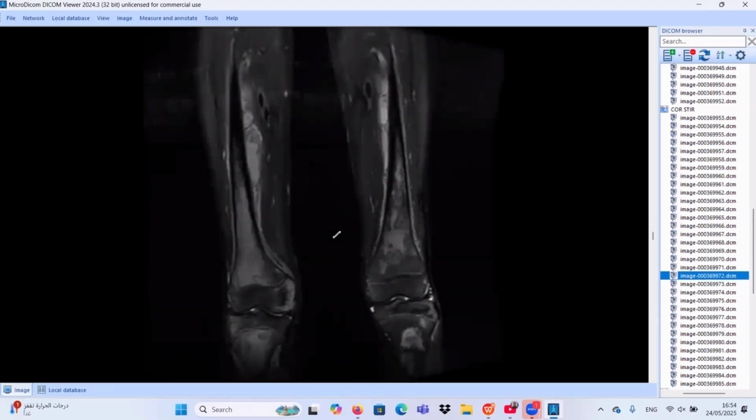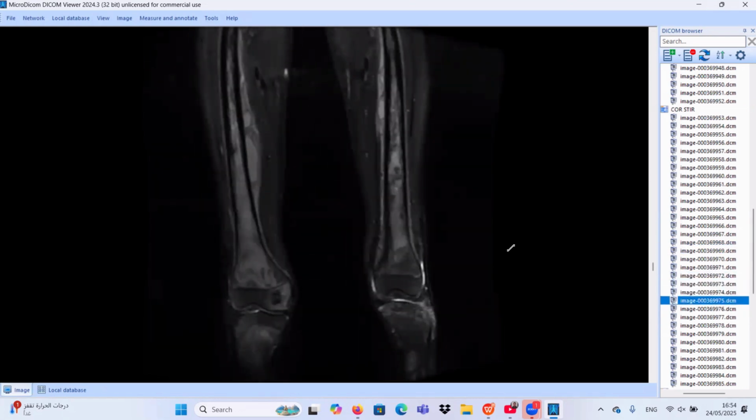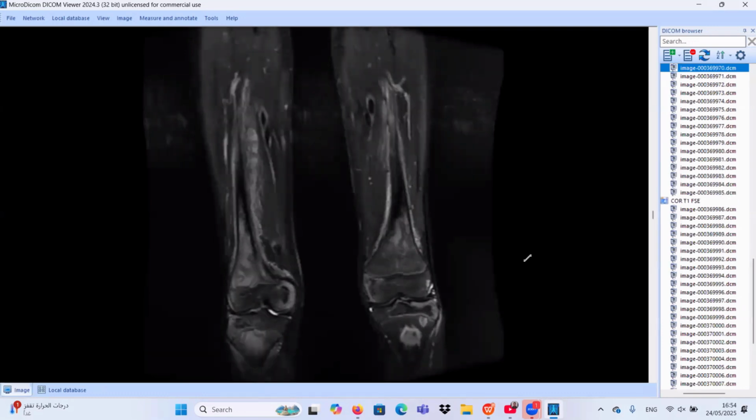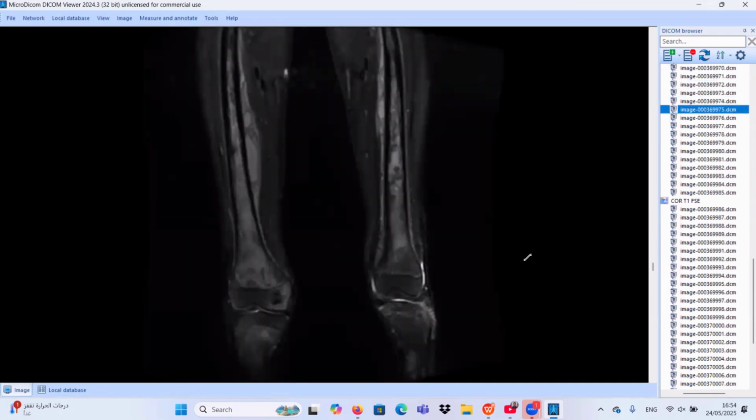Okay. According to what's your opinion? I can suggest, according to the findings and the age group of this patient, that we are in front of an infiltrative bone marrow process, with multiple infarcts and a hemorrhagic component of the subperiosteal collection, suggesting we are maybe in a sickler patient. Very nice, very good. Okay, so you got the diagnosis.